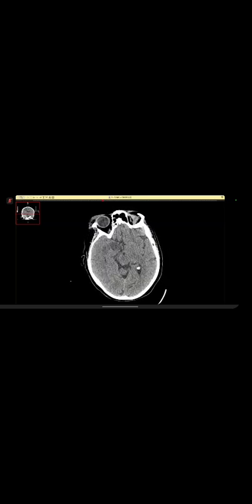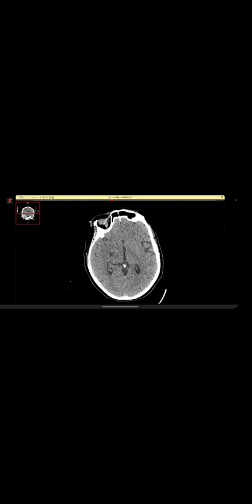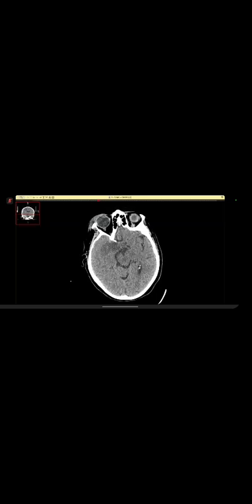So this is the first CT on which we can see that there is that old infarction. We can see that there is a large mass. This mass involves the middle cranial fossa. The temporal lobe extends here. Actually, you can see how it extends superiorly. Now, as we trace it inferiorly, the whole of this is the mass.